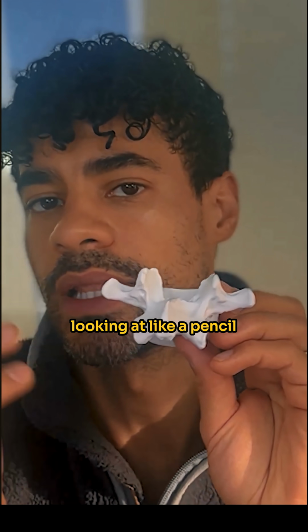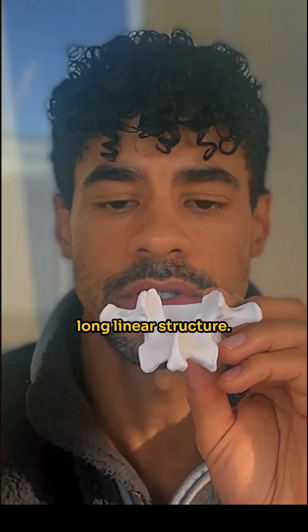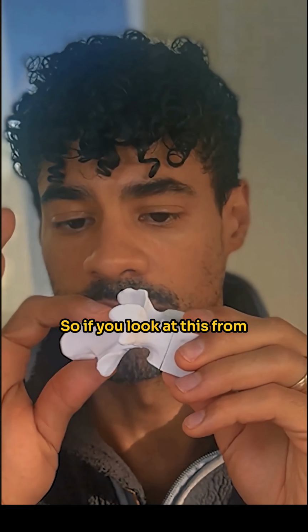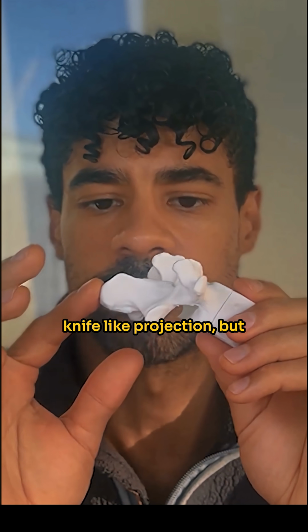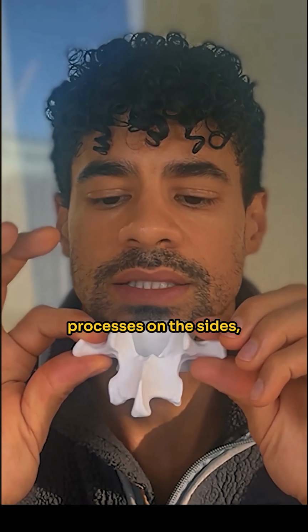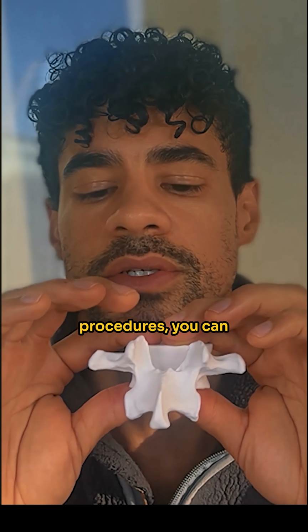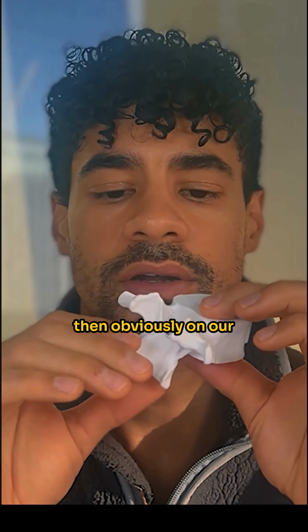So if you were to be looking at like a pencil, for instance, on a profile view, it would look like a long linear structure. However, if you were to look at it just from the eraser, it would look like just a dot. So if you look at this from a profile view or a lateral view, it looks like this knife-like projection. But if you turn it, it's more of a linear beak-like shape. And then these transverse processes on the sides, they're very radiolucent oftentimes when you're doing these procedures. You can see them pretty well on our x-ray here, and then obviously on our three-dimensional model too.